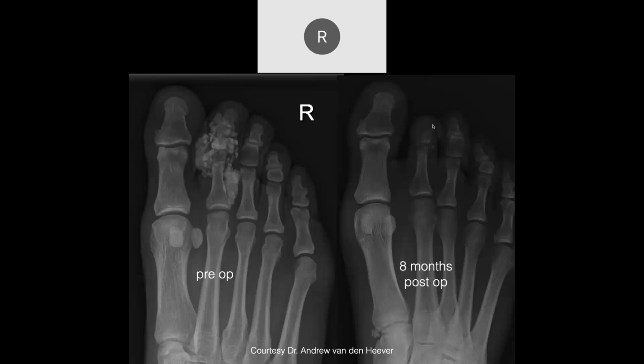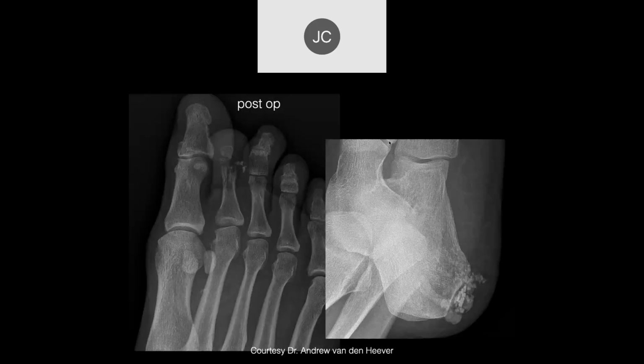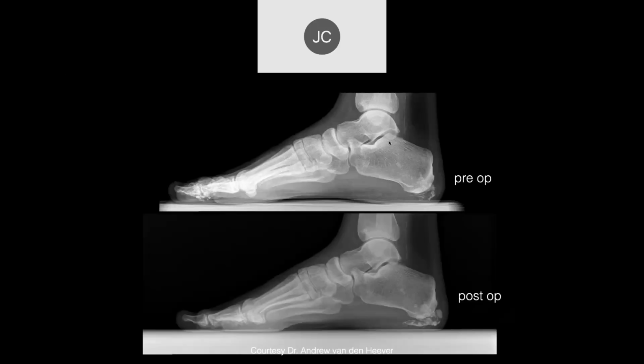There's a little bit of calcification there, and then it looks like there's been partial amputation. Probably the middle phalanx was amputated, and the distal phalanx is now sitting here with the distal tuft right there. And then here we can see calcification in other areas in this particular patient.